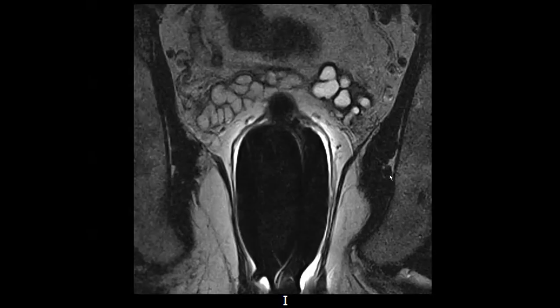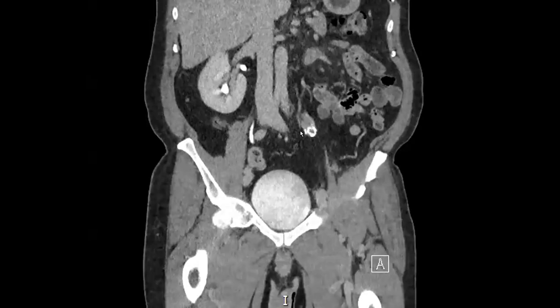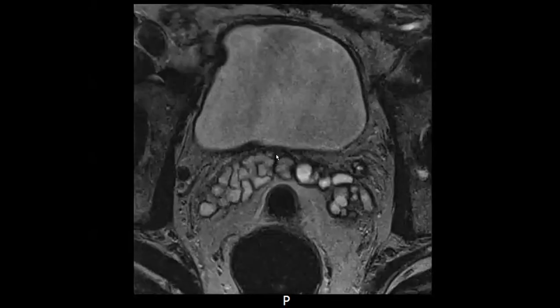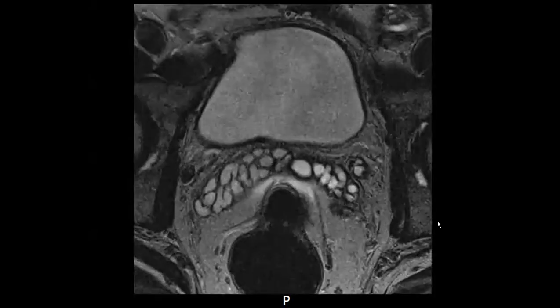We don't know that because by the time we got the CT done, the kidney was already atrophic. Reflux. And that's the kidney, and it's also pelvic. So I don't think we would be able to know that. Although I think the right seminal vesicle still looks okay. The left looks slightly more dilated. What do you think? Would you call the entire thing bilateral dilation? No, it depends on if they've had ejaculation recently or not, but that's within normal limits if they haven't ejaculated.